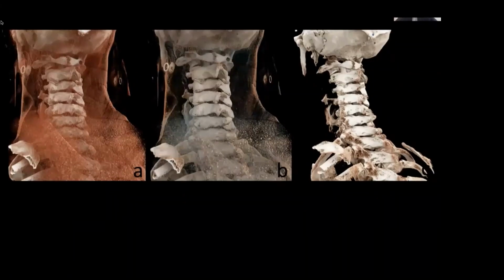If you're looking at robotic surgery with anatomic trajectories to place your instruments, this is not going to be reliable. And this is not going to be reliable, not because the imaging is unreliable, but because the technology of overlaying imaging on physical objects is not reliable.